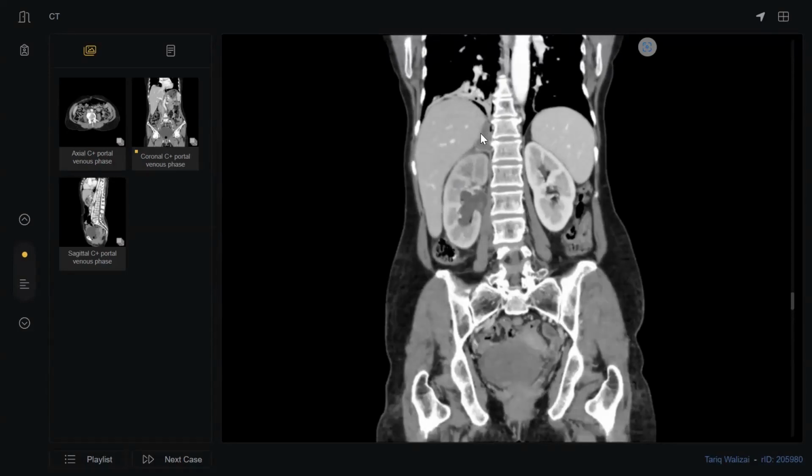What happened for the suprarenal here? Suprarenal also has a collection within it, a hypodense collection. This could be because of adrenal hemorrhage within the adrenal. Thank you, doctor, but you didn't tell me your next step, your management.